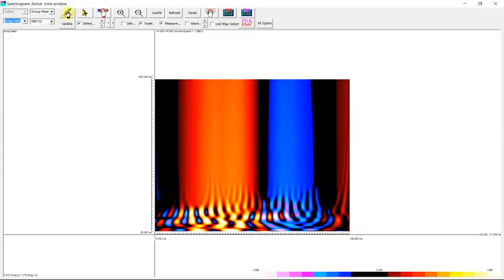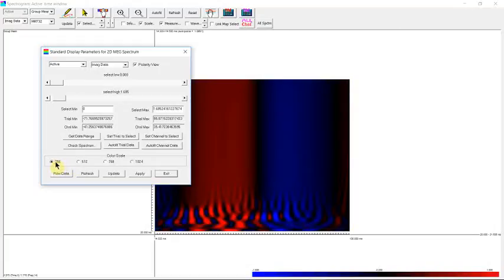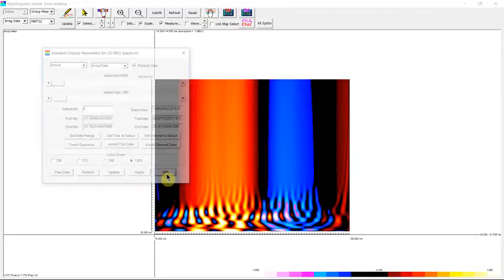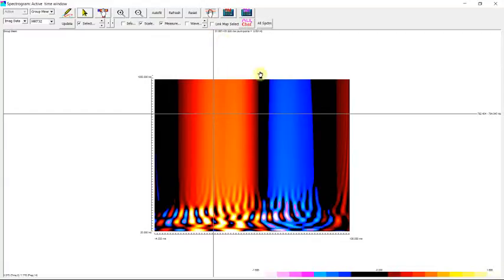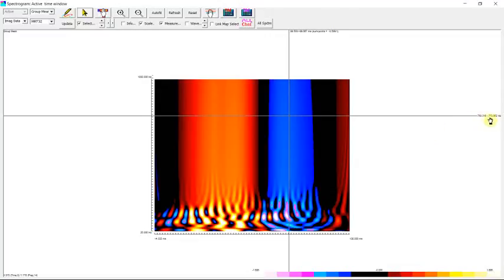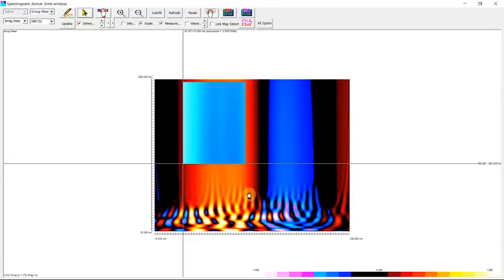So this is a different way we look at it. Of course, we can change the scale. Spectral default. And here, use the cursor. You can measure the latency. And here is the frequency. This is the entire window from 14 to 138. So the time window is from here. So this is in milliseconds, 29 to 79. That's a spectral power. You can measure the entire stuff.